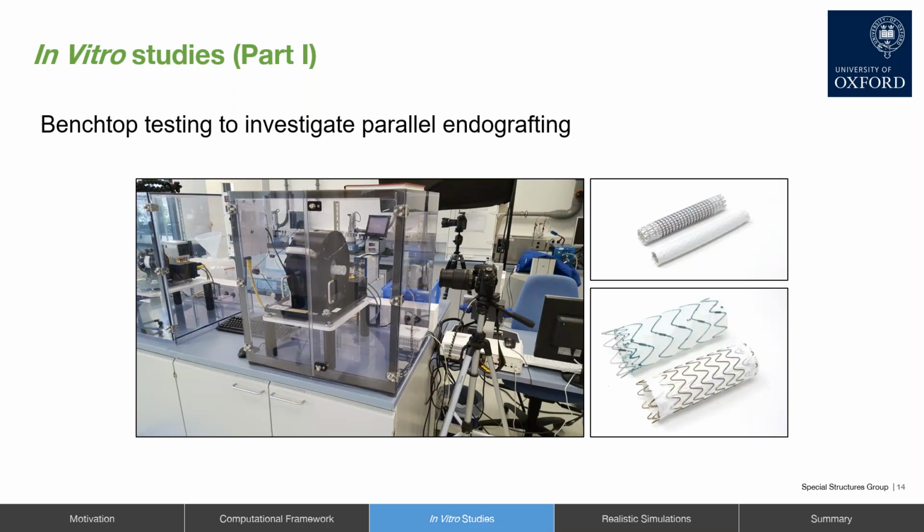Now, what does that benchtop testing actually look like? Well, what we have here is our radial force tester inside a temperature-controlled chamber. Now, owing to the availability of the test system, which we used during the aforementioned validation work, we extended the protocol to study parallel endografting of various devices and device configurations, noting here that we also employ a video system to capture mechanical deformations.